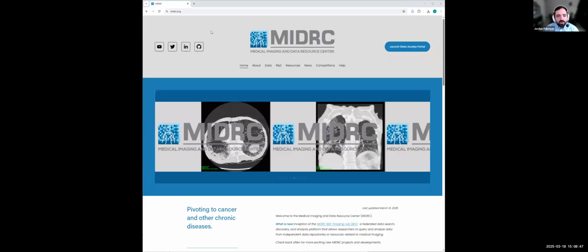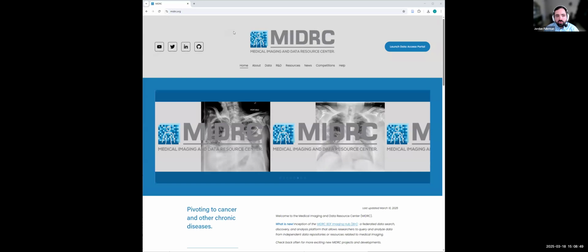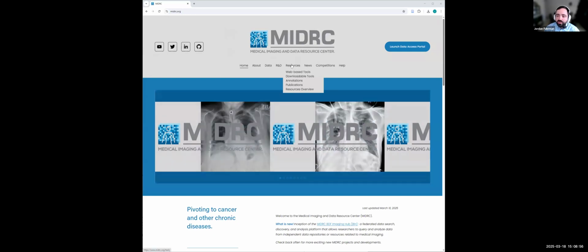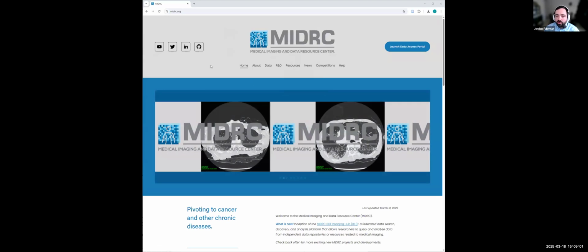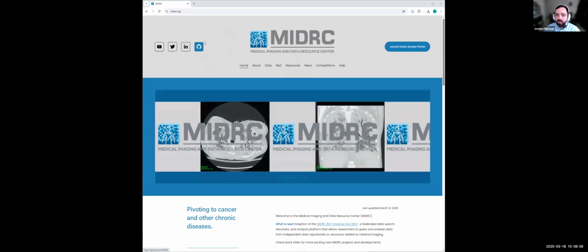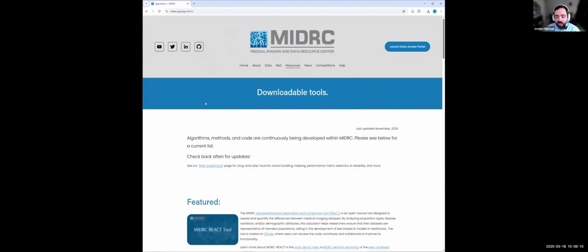All right, thank you, Hui. So I'll share a few different pages, if you bear with me while I jump between these. I'll start by showing the MIDRC main website and how you can navigate to our tools from the home page. The main way is to just go to this resources tab where you can click either web-based tools or downloadable tools. And for some tools, specifically most of the downloadable ones, you can access through our GitHub through this icon. But I'll use the resources tab to first show the React tool.